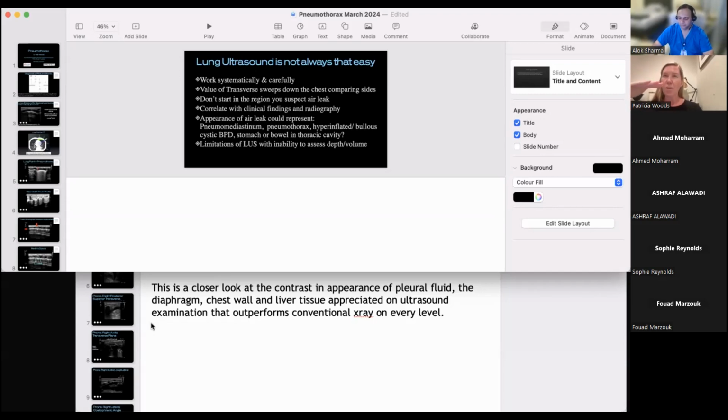It's probably because it's acting as such a strong mirror, such a strong reflector. You're getting incredibly strong signals through the tissue, because remember, you're not looking at anything, it's just artifact created from those superficial structures. You're not going to find the lung line. You can't look at it and say, there's the depth, there's the limit of the visceral pleura.